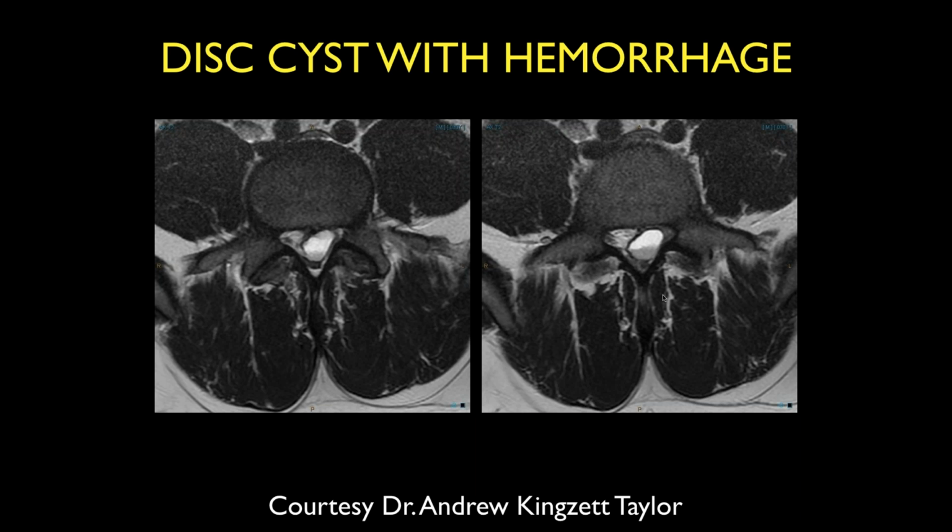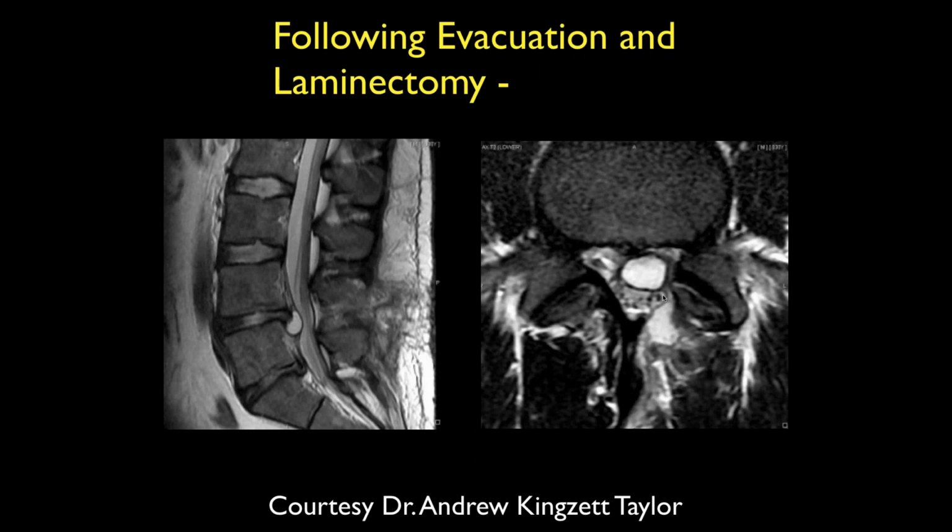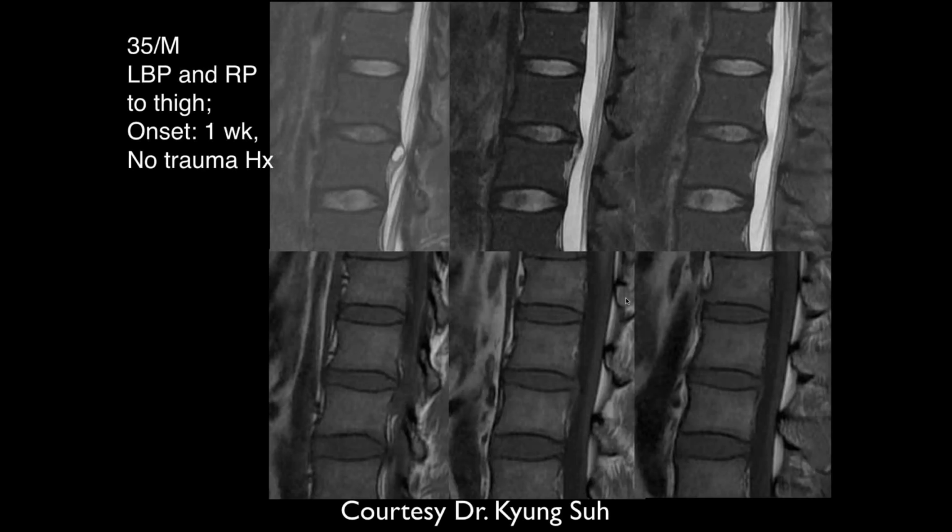I see. And then, yeah, here's another discogenic cyst after surgery. So they went in and removed an extruded disc, and in the area where the disc was, now there's a cystic collection in that area. So it's a recurrent. Okay, Thomas.